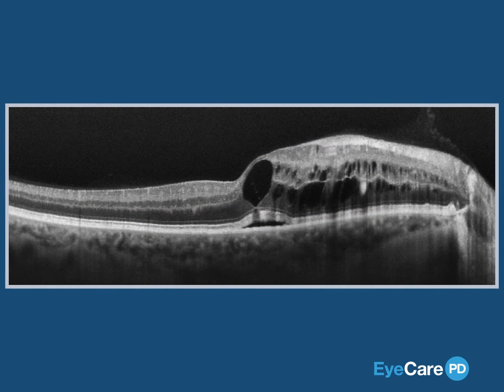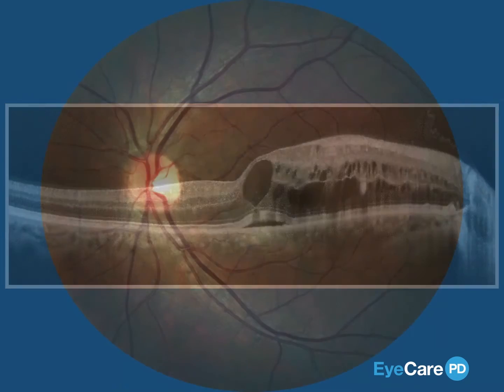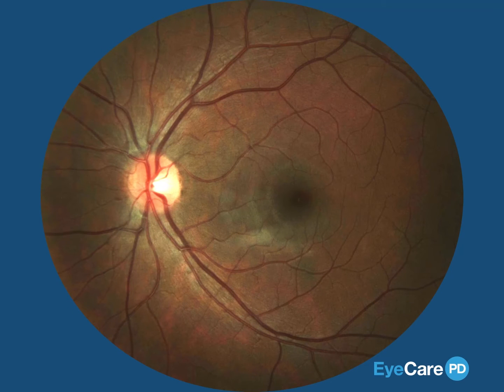This is a retinal vein occlusion by OCT characteristics. How do I know? Well, that's a good question. If you recall the pathophysiology of a retinal vein occlusion, you will remember that the venous obstruction causes a relative delay in arterial filling due to the closed-loop nature of the eye.